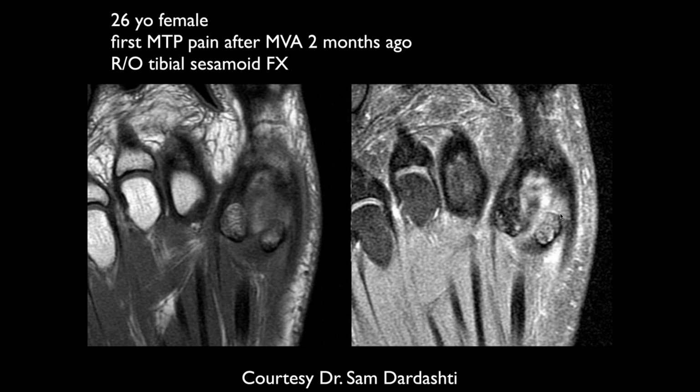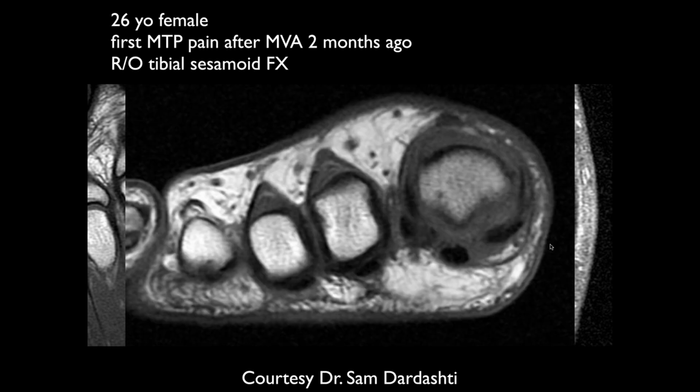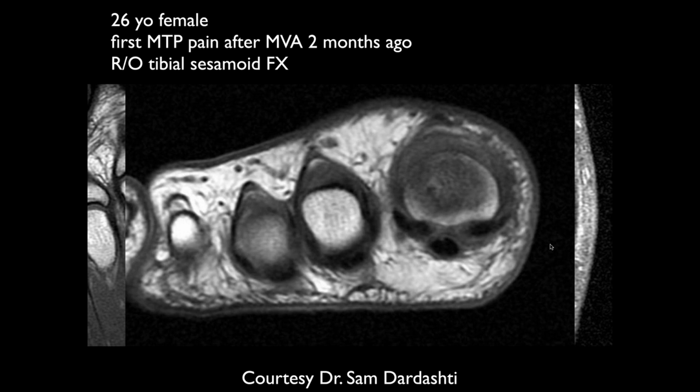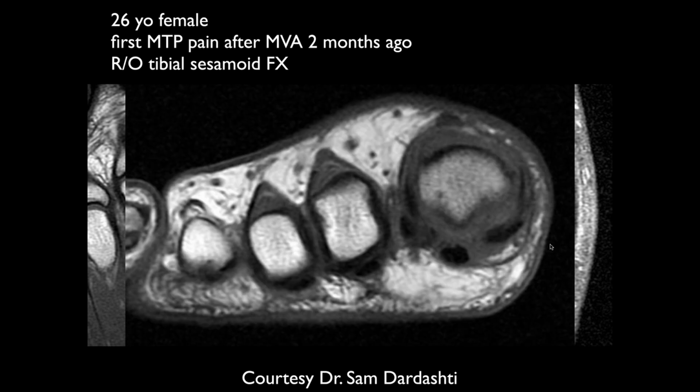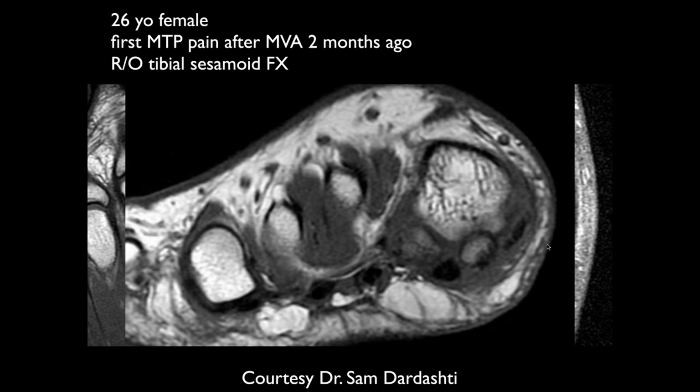Yeah, so here it's very nice. You can see the tear of the sesamoid phalangeal ligament medially, and it's intact laterally. So that's a nice example of this. Here are the coronal images through it. Let's see, this one we follow back here. It looks relatively normal at this level, but if we continue going through it here, we can see the changes here.